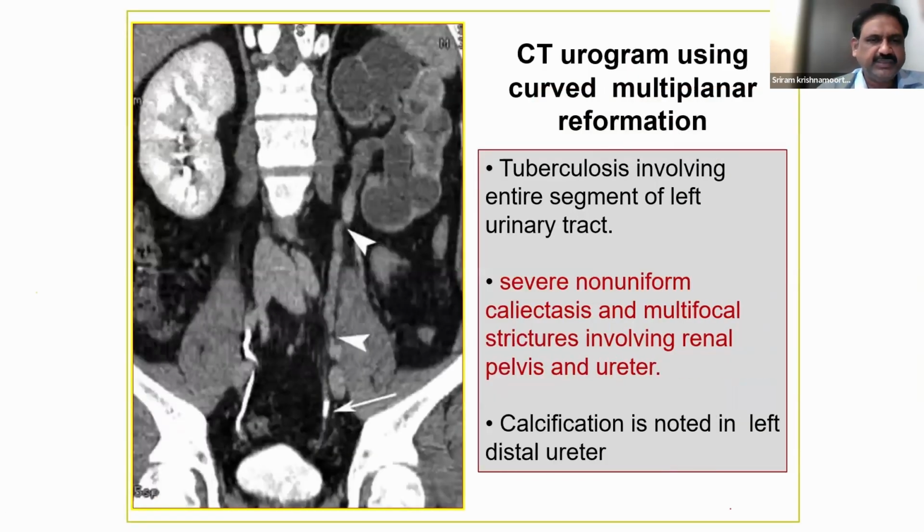Yes. So here you can see that the entire kidney is affected on the left side. You can also see the entire ureter getting affected there. And then on top of that, there is something like a stone in the distal ureter. If the kidney is non-functioning or non-visualized, none of these factors can be appreciated in IVU, whereas all this information you get with CT. That's the reason why, when the exam asks you, you can boldly say that CT urogram is the investigation that I would like to do in place of an IVU. Okay, next slide.